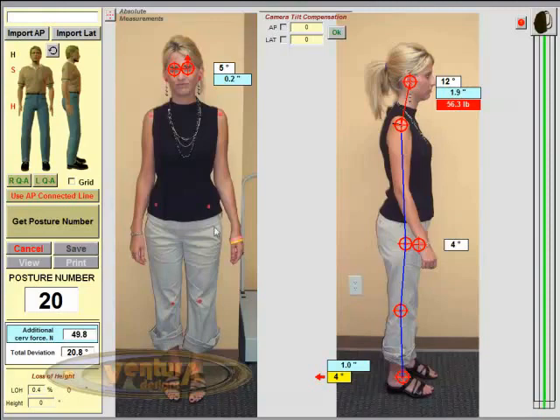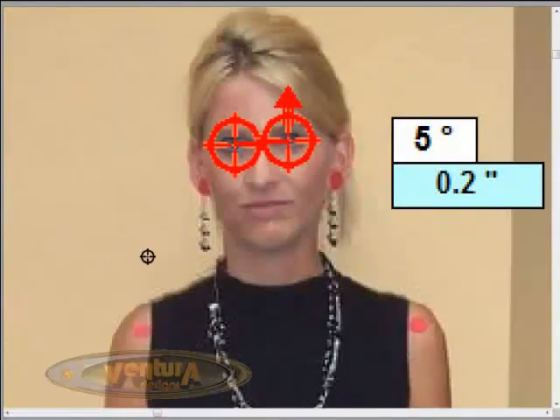And we do the same thing for the shoulders. We come over to the cartoon figure, and when it changes to a crosshair, we click on the shoulder, and that tells Posture Pro to assign these values to the shoulder area. Now, this picture, which was sent to me by a doctor for evaluation, they put the dots on the wrong place on the shoulder.